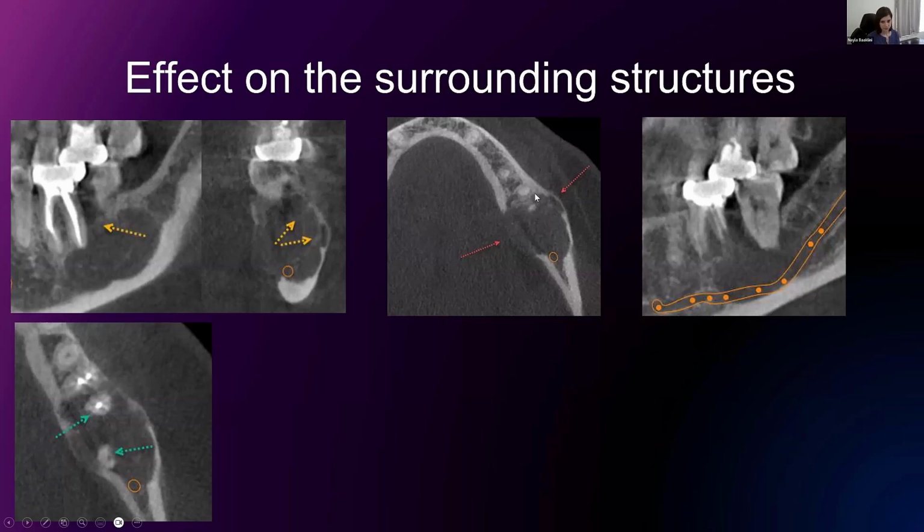So when we talk about non-uniform thinning, non-uniform expansion, we usually think of a neoplastic process. Usually when a lesion causes expansion, has time to grow, and causes non-uniform expansion, it is usually a benign neoplasm.